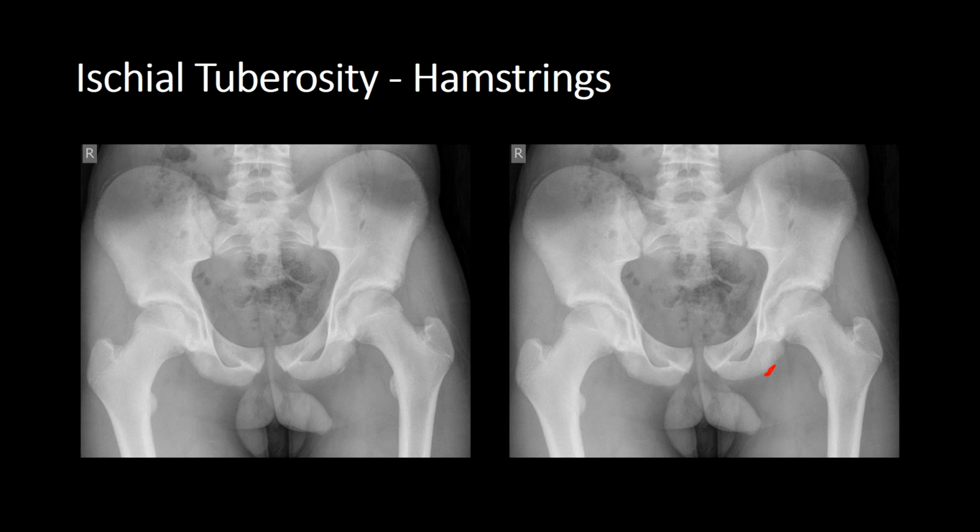So as always, when you're evaluating the whole of the pelvis, it will be when you're checking the outer cortex of the pelvic ring that you'll be able to identify this injury. But you will still need to keep checking the iliopectineal line, the ilioischial line, look at your obturator foramina, your symphysis pubis, your SIJs, your sacral foramina.